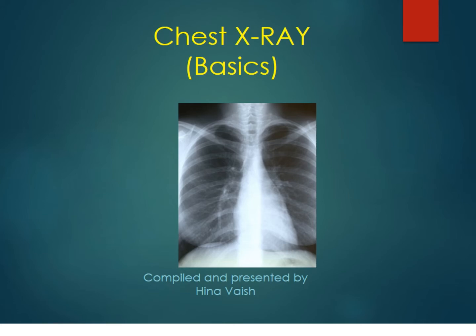Today, I'm going to talk about chest X-ray basics. That is how to interpret a normal chest X-ray.